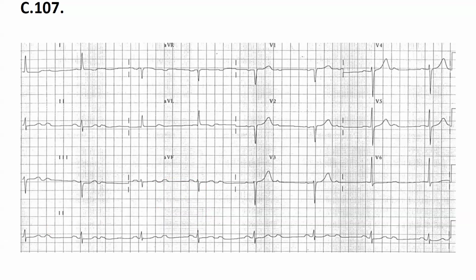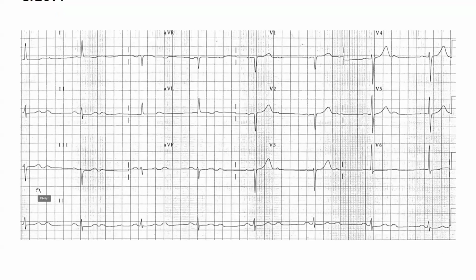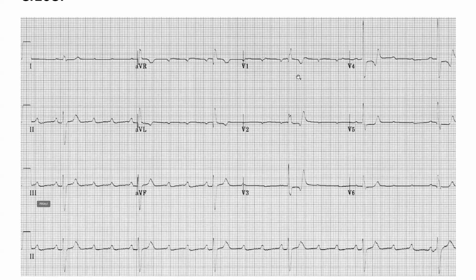Let's move on. Okay, I have to find the next tracing. Yes, that should be the following one. Okay, come on. Yes, that's it. And who has this one? Cheyenne? Yeah, that's me. Okay, good.